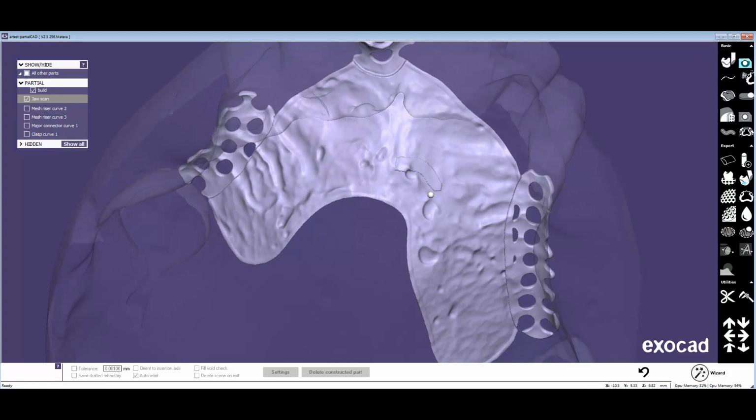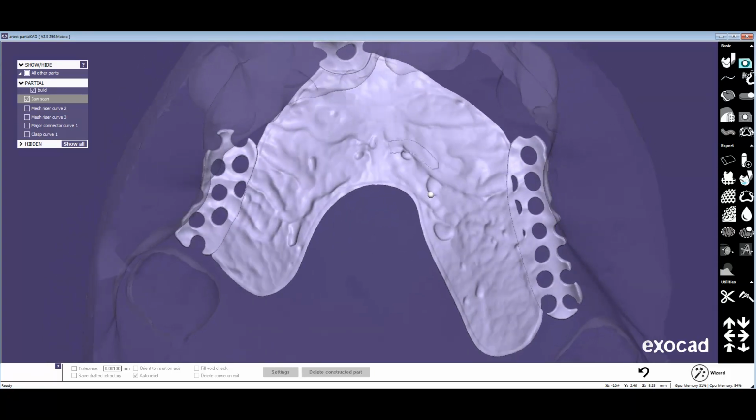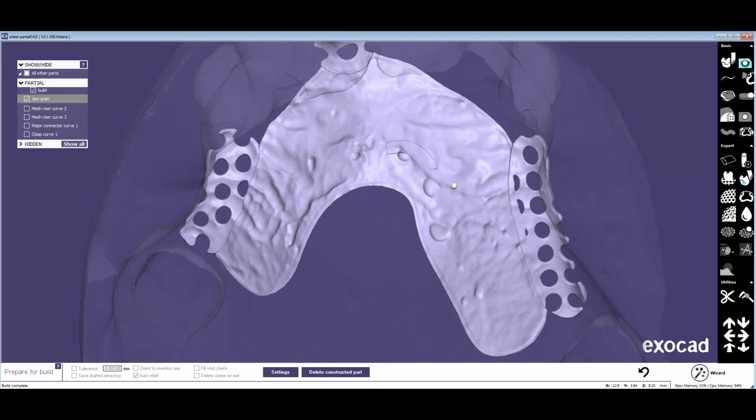But nowadays, that's no longer true because, first of all, if you mill it, it will definitely show up. And printers are much better than they were before. So 4 or 5 years ago, when people complained about this, we just told them, well, don't worry, you won't see it in the final partial. But now it's there. So I think using this other technique is better. At least it is a smoother edge. So let's take a look quickly in Exocad and see what this looks like.